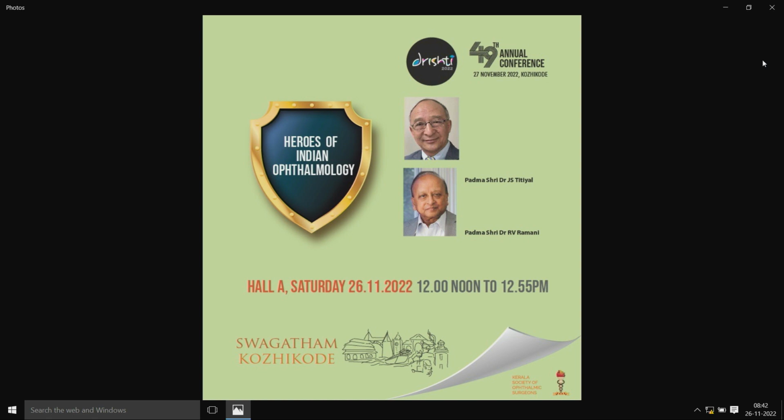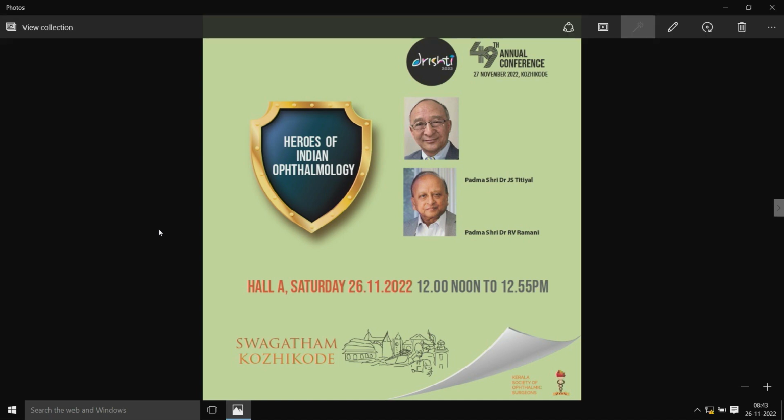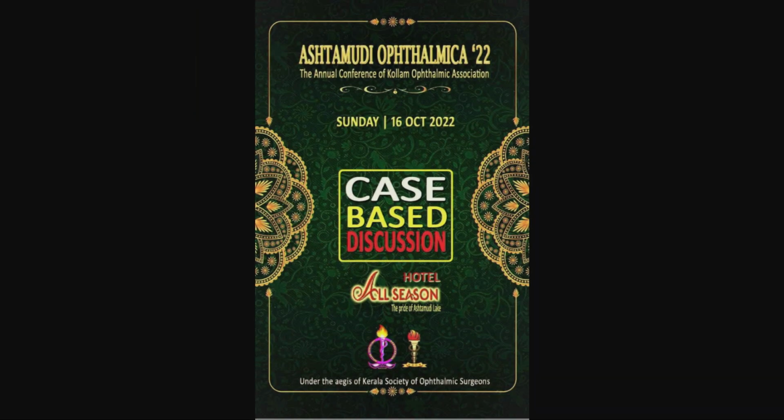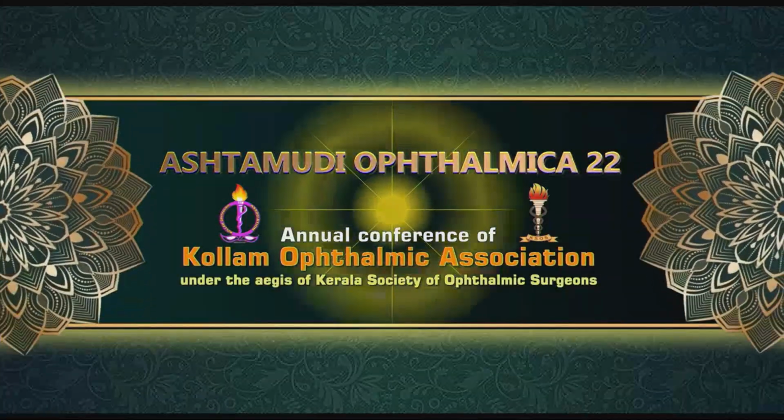Luckily, I had a peripheral fundus imaging of him, like an ultra-wide field image. I could show him and say that, see, it was attached at the time. So I have made it a part and parcel of my practice. I have an imaging person who's taking pictures. When a patient comes in, almost all, I make it a point to take. So it has really changed the way I manage, is what I would like to say.